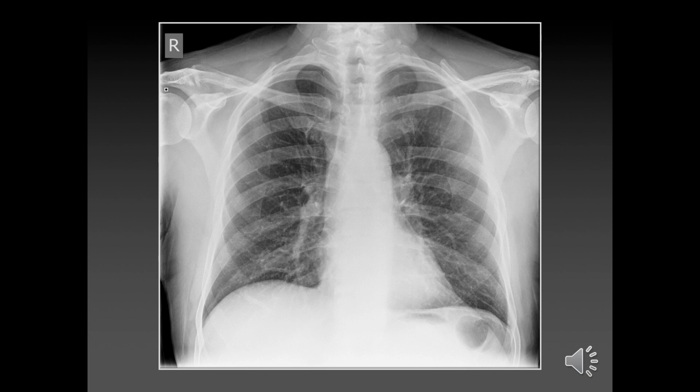Okay, so looking at the airway, is that normal? Yeah, it is not deviated. You can see it's slightly going to the right, but as you said, it's completely normal. So in B, what are we looking at? Breathing, so lung fields. Okay. There were 3 bits of breathing, weren't there? So lung fields, hila, and costophrenic angle. So 4 bits. It's like a Monty Python sketch, isn't it?